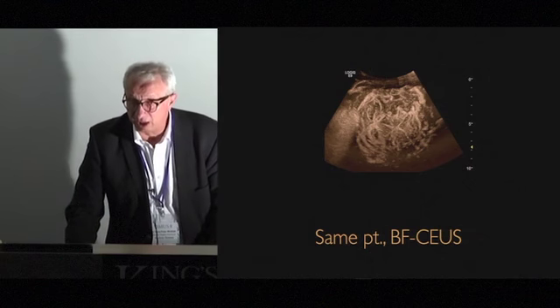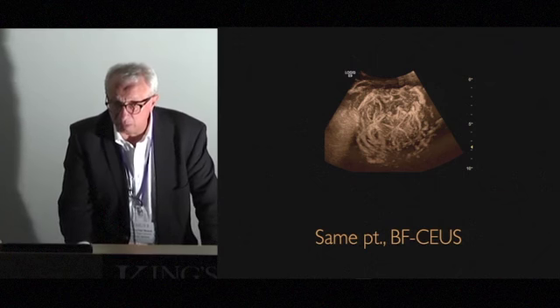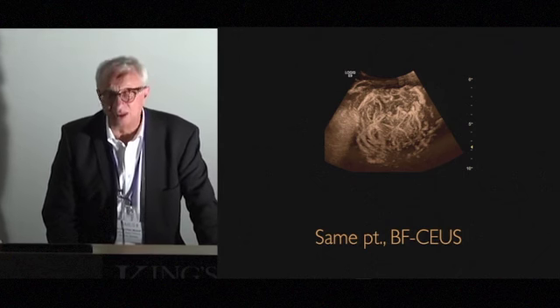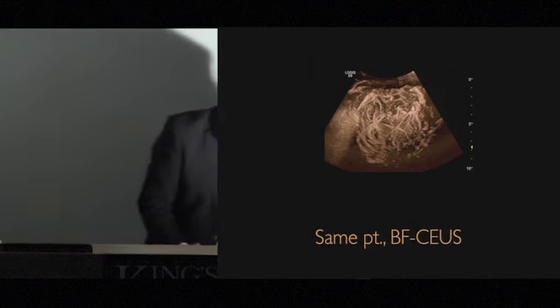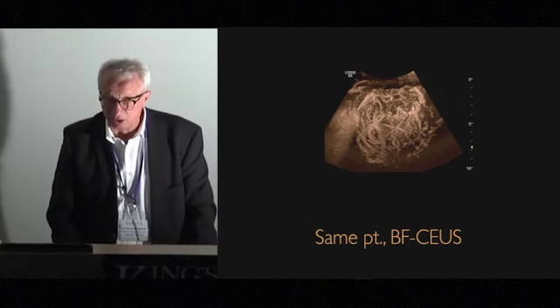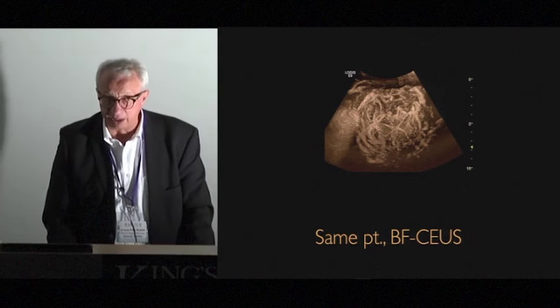And what you can see is not only one, but multiple stellate patterns of arteries. At least you can see 3. I have no pointer here. It's not working. But I think you can see it quite nicely in the center, then left to the center and above.